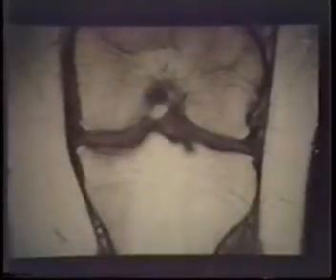The medial collateral ligament over here on the other side is more anteriorly located, and it's just a black structure of uniform thickness from the medial femoral condyle across the joint space to the medial tibial plateau. The one thing I would like you to notice, for those of you who do arthrography, is that there is a bursa that is not normally filled at arthrography, which separates the superficial fibers of the medial collateral ligament from the meniscus itself.